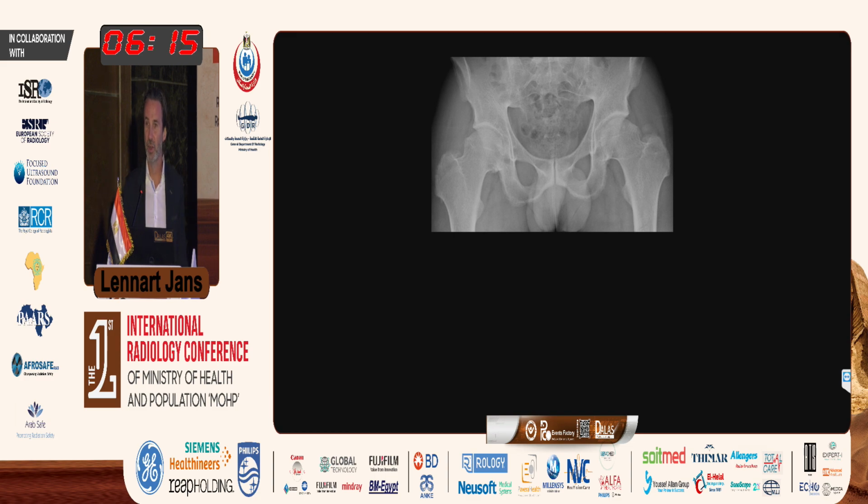And something that I really wanted to point out, because this is what I see in daily practice very often, just a normal radiograph, we also see this very often. And if you look at this, the both sides of the hip, you can see that there is a cam deformation, right? So these patients very often, I don't know if I have a pointer. No. So there is the cam deformation. So on the sides of the hips.